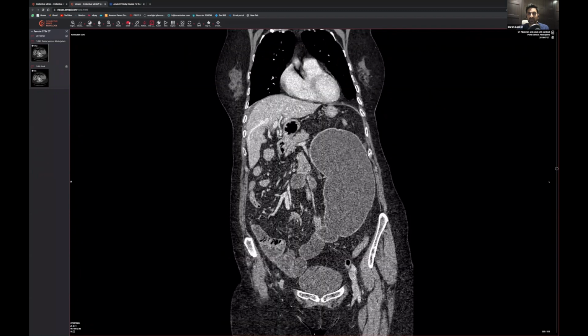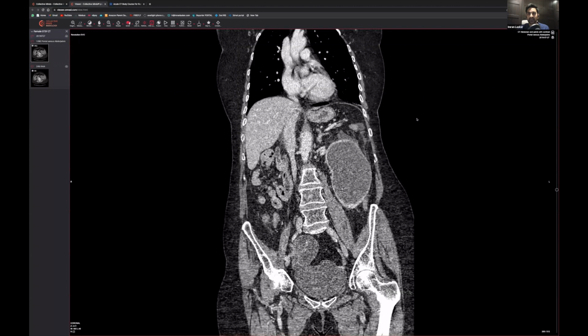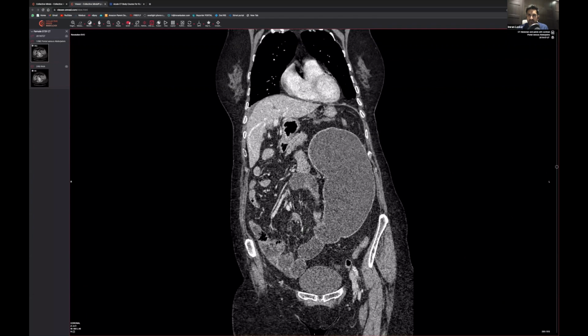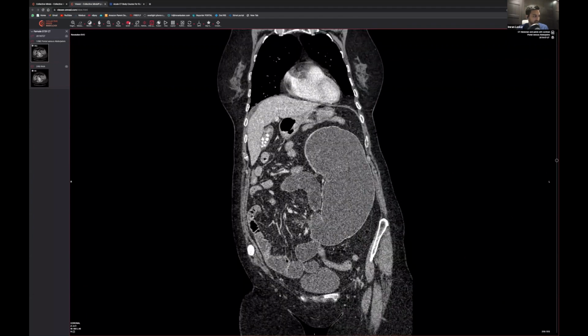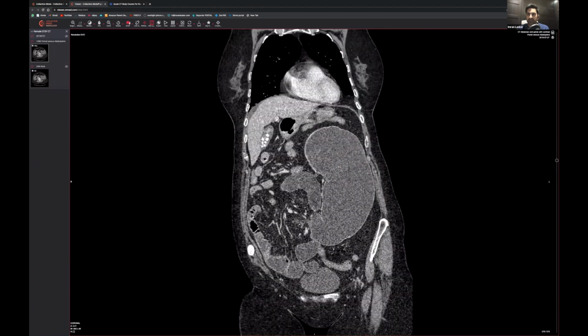People have said, is this a cecal volvulus? And that's exactly what this is. This is a cecal volvulus. And so what's ended up happening, can you see here? That's a twist. There's almost like a whirlpool thing going on somewhere around here, twisting into here, and then going into that. So that's the cecal pole, twisting like that.